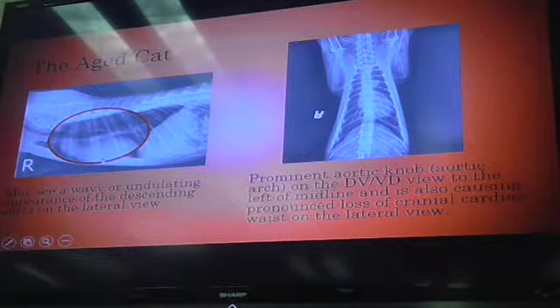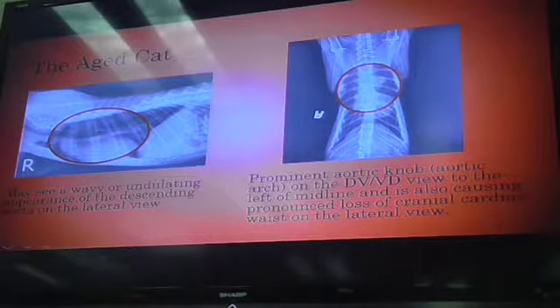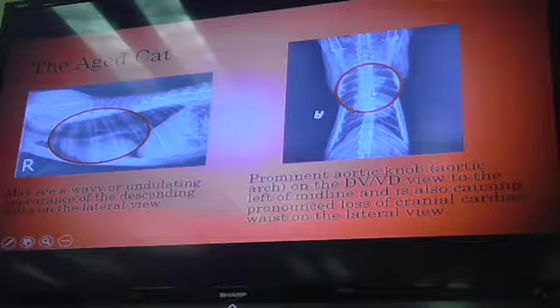All right, so we saw the heart here, and if you follow this out, you're on that aortic arch, and then you're going into the descending aorta. Everybody appreciate that bulge right here? Okay? And then this one works. That sucks. Then you see this little knob. Where's my arrow? There she goes. There's my arrow here. So it's kind of like this little bunching at that area of the aortic arch.